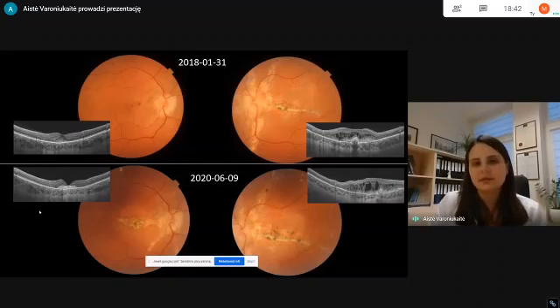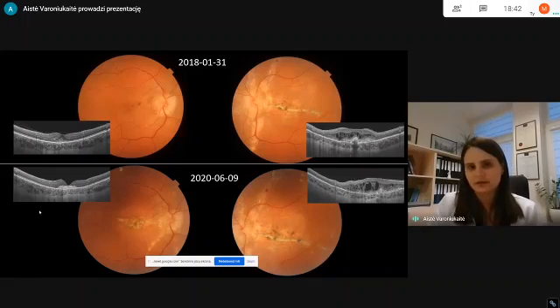What is really important in this case, in this picture you can see the pictures of both eyes of this patient at the first and at the last visit. As you can see, it's quite clear from the beginning, looking at the patient's left eye, that there are angioid streaks radiating from the optic nerve disc to the periphery of the retina, and one of the angioid streaks is already going through the macula and fovea region with fibrotic degeneration and cystic intraretinal fluid.